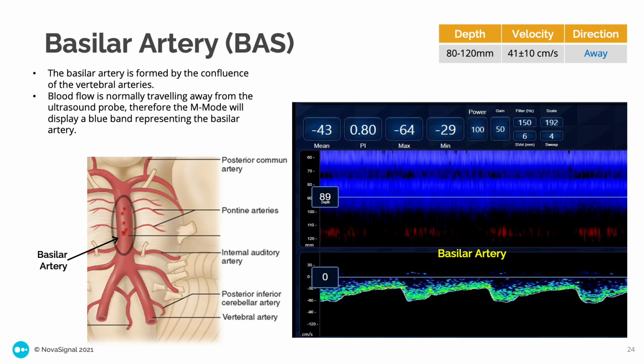It's important to note with your M mode, try to never move the sample gate into regions where the color is not filling well. So for example, in this slide, if I wanted to look at a depth of 75, you can see the color's a little sketchy. Or if I wanted to listen down here at 105, there's essentially no color.